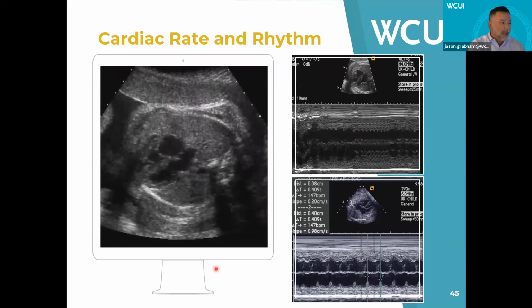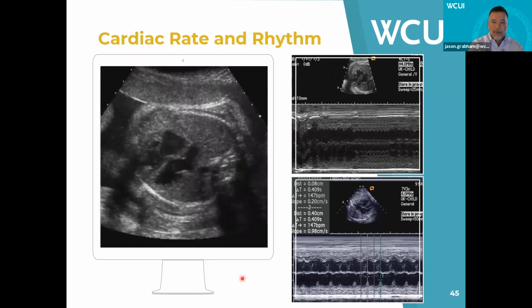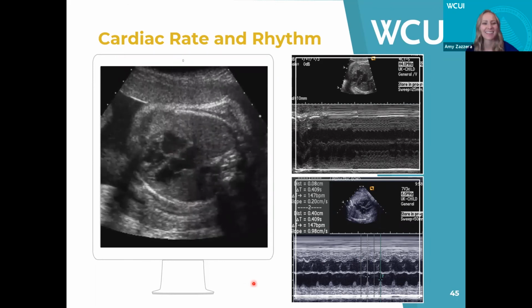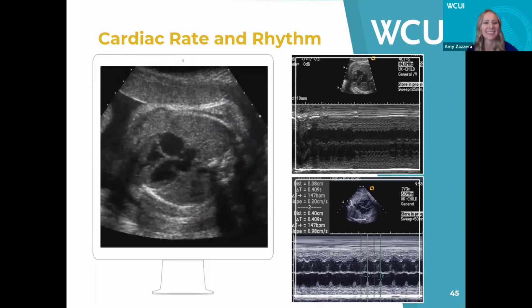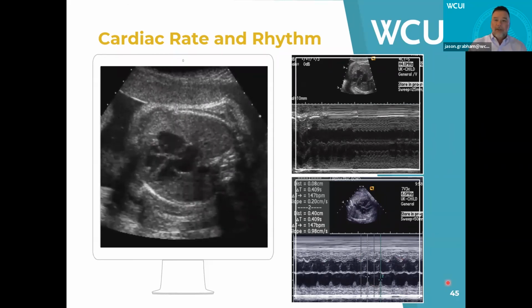So a lot of people still use M mode. I still use it sometimes, although I'm coming into the new era of pulse wave analysis. So, catching up. But thank you, Amy, for making me realize my age. And we're going to move on quickly.